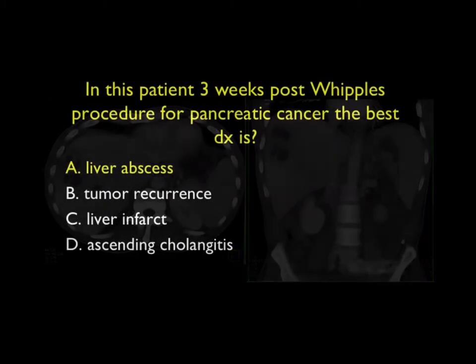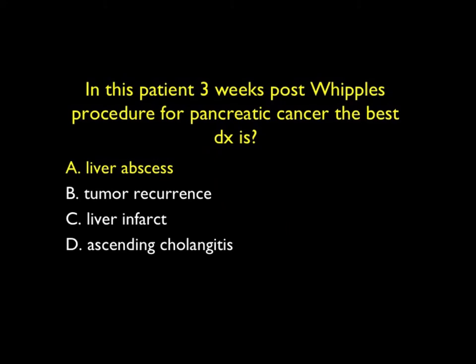This was a case of multiple abscesses. You know, with abscesses, you often get a cluster sign. This is a cluster, multiple low-density lesions with decreased perfusion around them. Very nice example of multiple liver abscesses. And we've seen a number of cases now of post-Whipple's procedures with abscesses, which at times can simulate metastasis. Just a very nice example and something to think about.